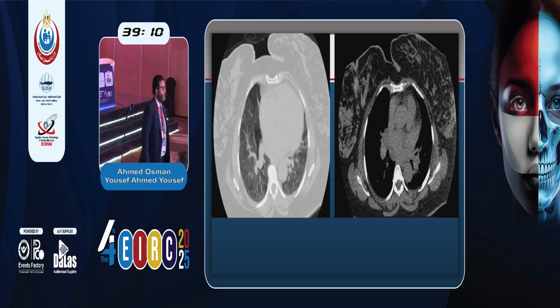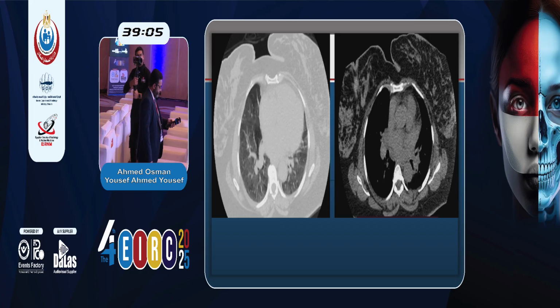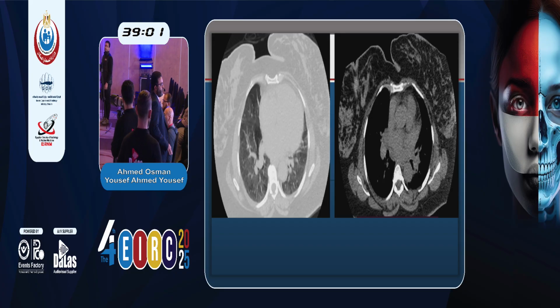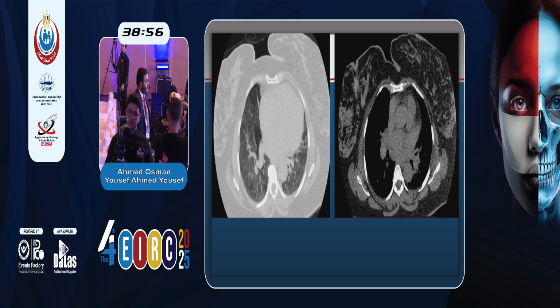Anybody can help me in this case? Any volunteer? Chest cases are very easy. You will not be completely wrong, so trust your opinion. Anyone?